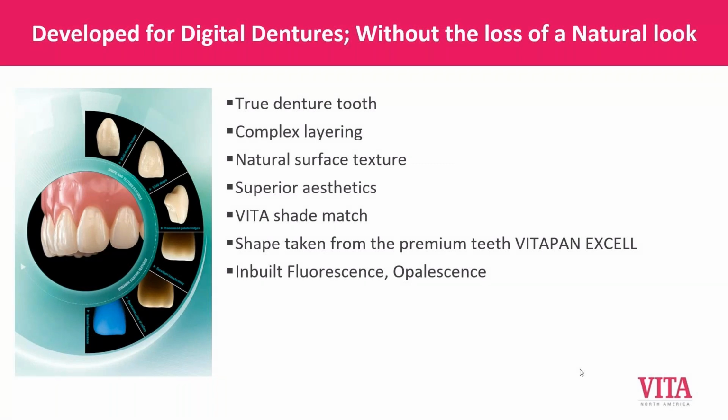Now, if you're doing lots of dentures or you've done enough of the digital denture stuff, you'll find that the couple of places where the Vigo has a hard time is if you've got that limited VDO, or if you're doing a single arch over natural dentition, because there's no way to modify those teeth in the software. So you would have to grind in the occlusion by hand, which is kind of a bummer. Which is why we have the 2.0 version or the exportable version, so that you can adapt that for those types of cases.